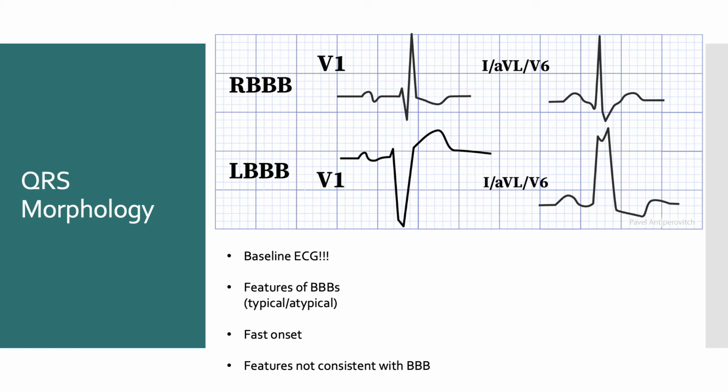Understanding this physiology is quite helpful when you look at Holters, because when I look at a Holter and the QRS looks wide, if I see the first part of the QRS match the narrow QRS, I'm thinking this is probably a right bundle branch block that comes and goes. Okay, so now let's look at a left bundle branch block. We mentioned that if there's a left bundle branch block, the QRS looks completely different than the narrow QRS. In V1, there's often a little R, and there's a very large negative S wave.